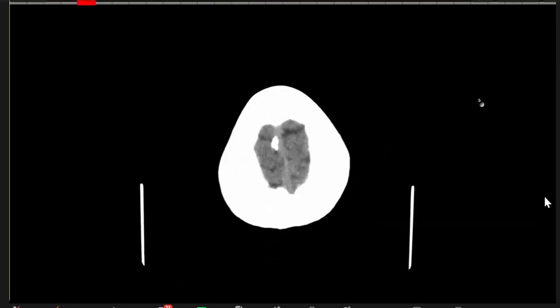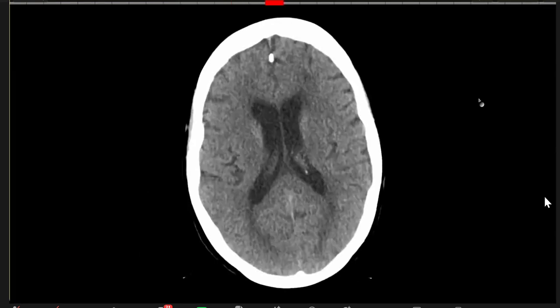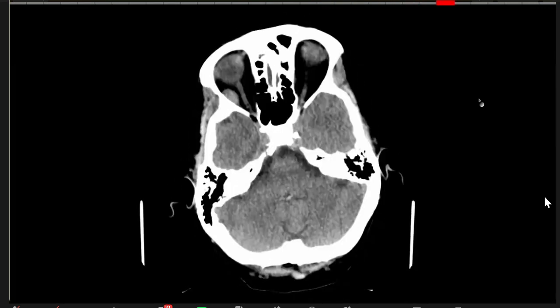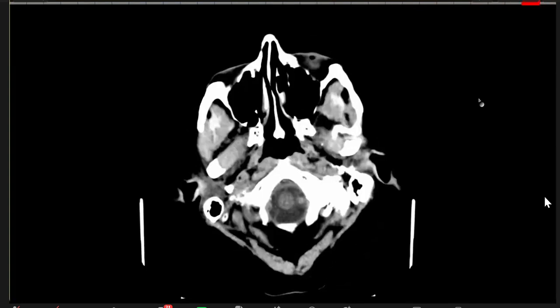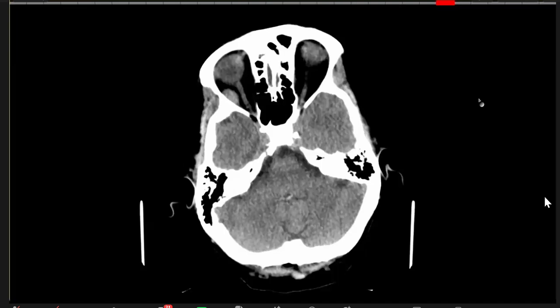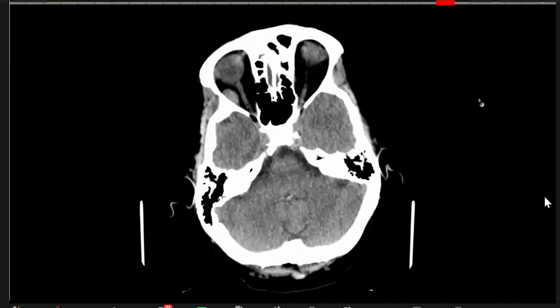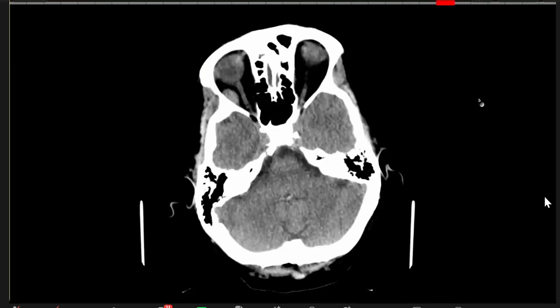These are plain CT head and neck images of a patient who is a known case of breast malignancy. I will give it a scroll and we'll start commenting then. In these sections, I have observed bilateral intraorbital extraconal soft tissue density masses in the region of the lateral rectus muscles. The bellies of both lateral rectus muscles are swollen, but there is normal tendinous insertion.